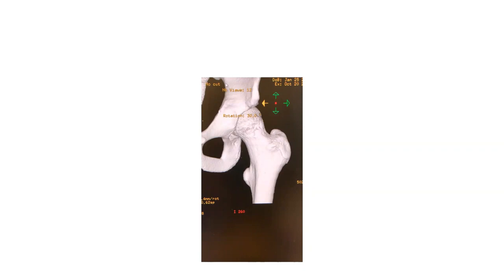Can I describe anything else based on what I see here? Not really, okay? Because I can't comment on a different plane. What about this x-ray right here?